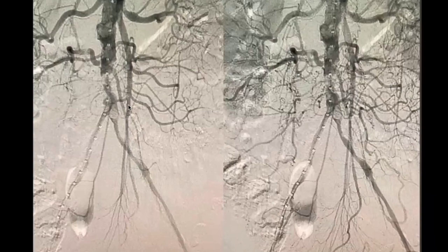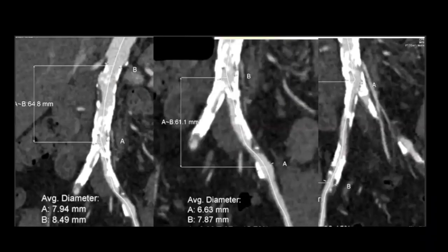The superior mesenteric artery, all right? Superior mesenteric, okay. This is the superior mesenteric artery. The inferior mesenteric artery is coming off down here. So again, anatomy. I know that this film is a bit complicated with the number of collaterals, but I'm showing you these angiograms so that you get your eye familiar with the anatomy here. So that's great. That's fine.